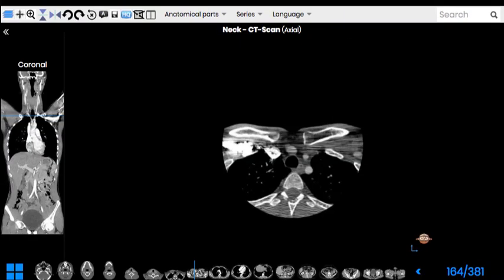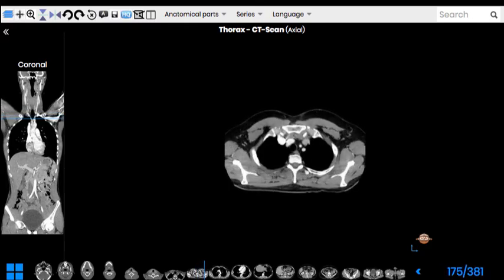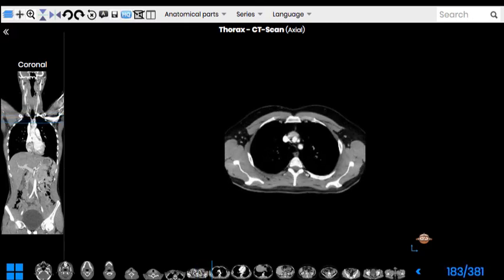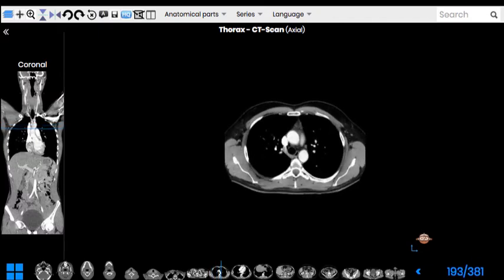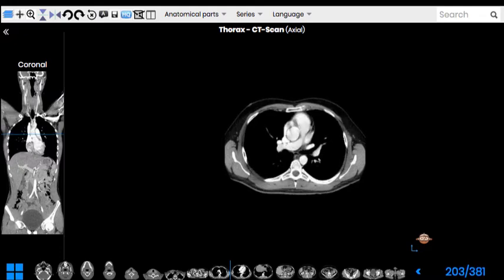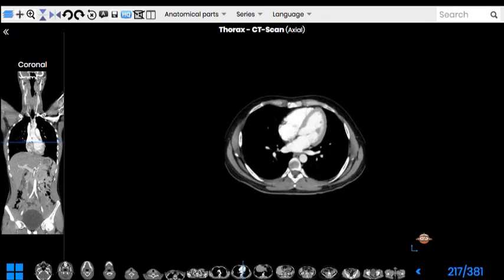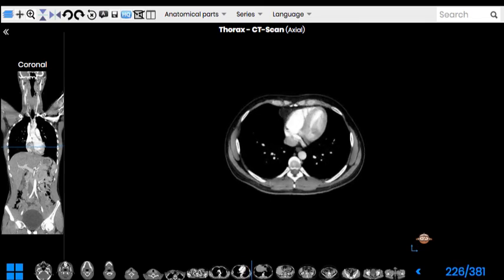The main features of the thoracic region are ribs, of course, and as I scroll down here you can see how these bones come on right and left and articulate with the bodies and transverse processes in 2 points. Here and here, the heads with the bodies and the costal tubercles with the transverse processes. And you can see the body shape and the shape of the vertebral canal are changed. The transverse processes have no more foramina transversaria. And the spinous process is long and slender here.